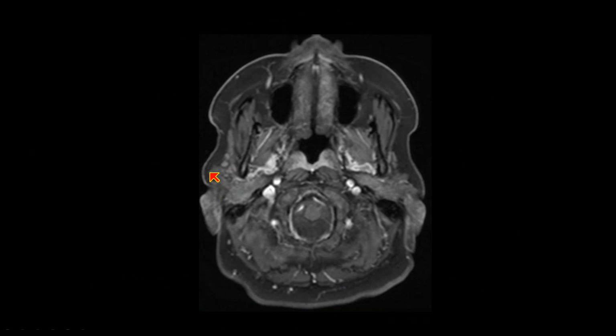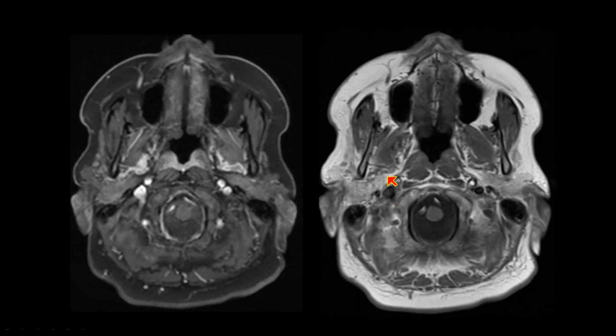I also want to pay very close attention to where I think there is enhancement and where I think there is no enhancement. This was a study that looked like it had bilateral enhancing lesions that somebody thought was a venous lymphatic malformation on the post-contrasted images. But if they had looked at the pre-contrasted, they would have said there was just normal fat at that location. So it's very important to pay attention to where that fat is. Don't ignore the pre-contrasted T1. Sometimes they're more important than the post-contrasted.